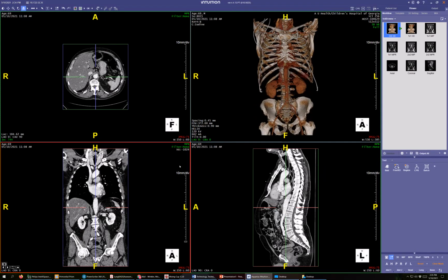I'm going to work on the TAVR case for the axis portion, and I'll try to do it the full fancy way and not take too much time.